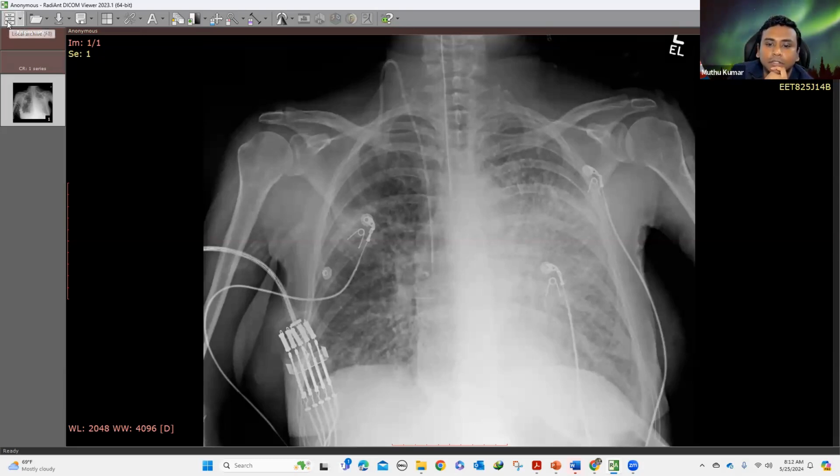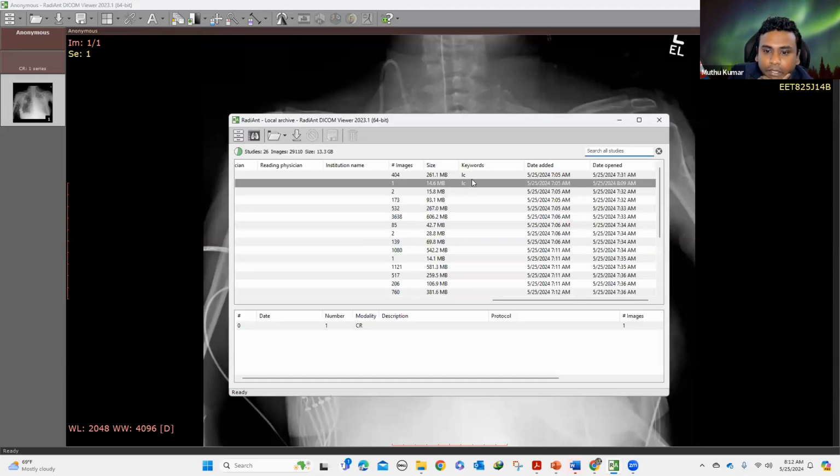Excellent. That's the diagnosis the patient is having. So what you are seeing is nodular, and you can clearly see there is a distinction between the left and right. There is asymmetrical, prominent interlobular septal thickening predominantly on the left as compared to the right. Right is also there, but predominantly on the left. And there are some ill-defined opacities at the level of the left AP window and also along the left hilum. So this patient subsequently underwent chest CT.